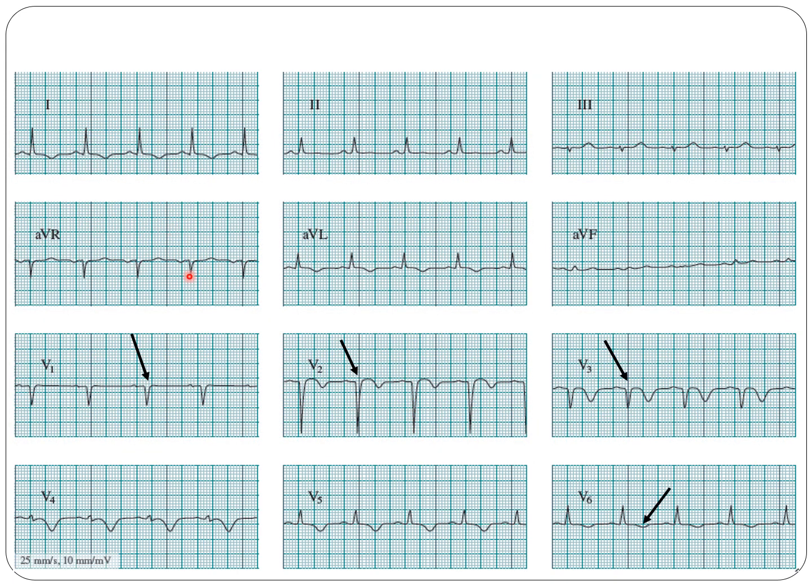Looking at the pathological conditions, we do have V1, V2, V3, V4, and V5, V6. First of all, in V1, V2, we do have the pathological Q wave and T inversion, and we do have the T inversion in V5, V6. And similarly, the ischemic changes can be seen in lead number 1 and AVL, so that can be a subacute anterior MI. In the high lateral and the lateral, we do have only the ischemic changes.